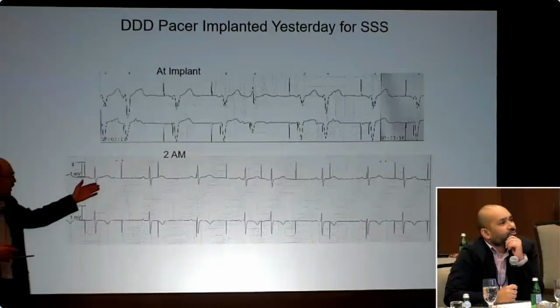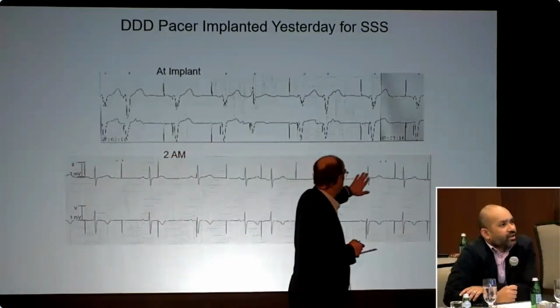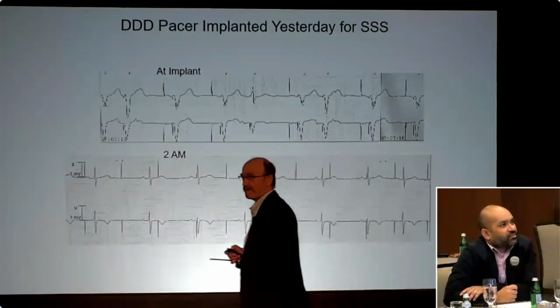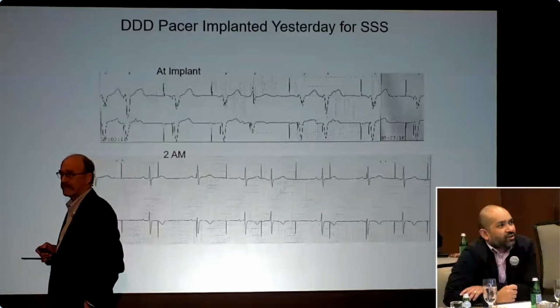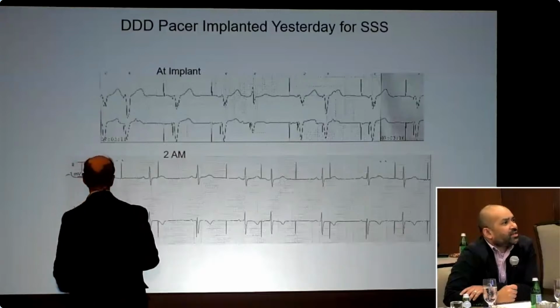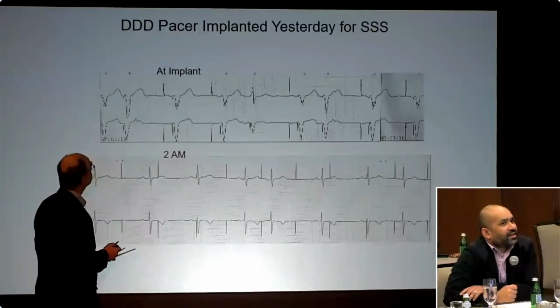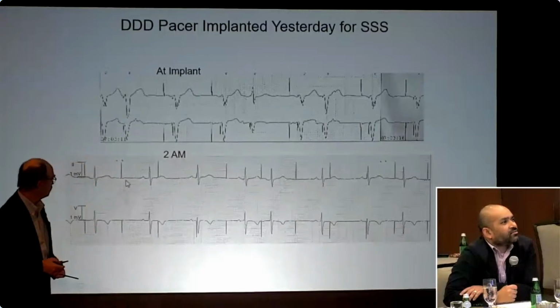Okay, so what's going on? I agree this is native conduction, but what are these spikes doing? As far as what the spikes are doing, one thing to consider is whether this could be telemetry artifact. I'm going to follow it along, starting all the way at the leftmost side of the page. That initial spike, I think I see a P wave right after it.